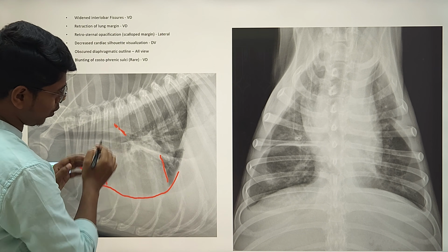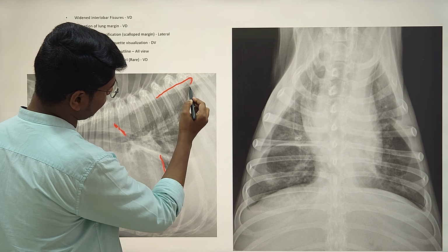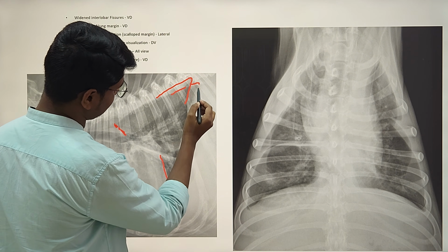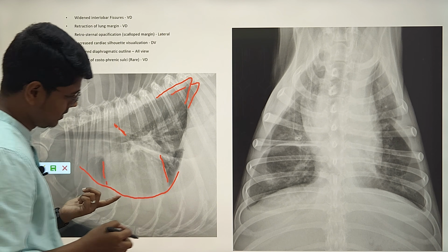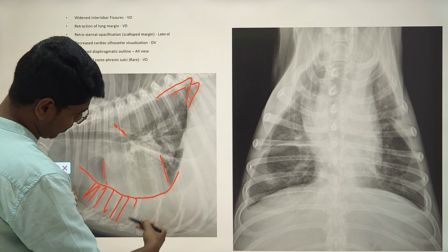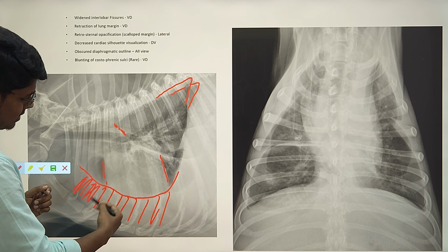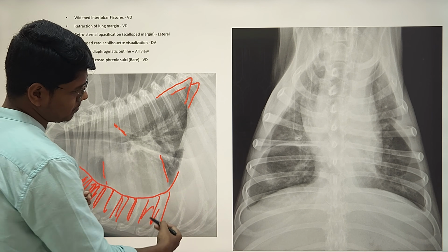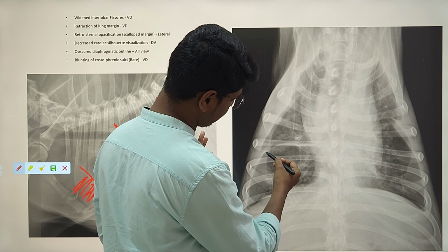You can see these lobes actually. And remember the margins. They are triangular. Here is one margin. Here is another margin. They are triangular. It means pleural fibrosis has not yet happened. So this particular area is radiopaque. This particular region is the retrosternal region. It is one of the clinical signs of pleural effusion. Let us see the VD radiograph. In VD you can nicely see some fissures.